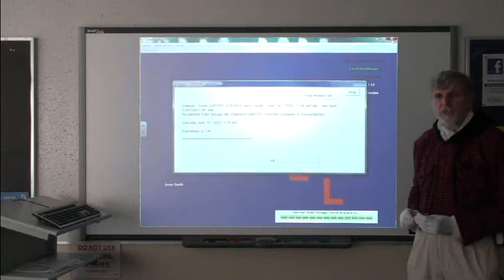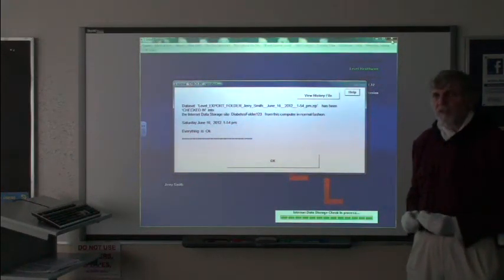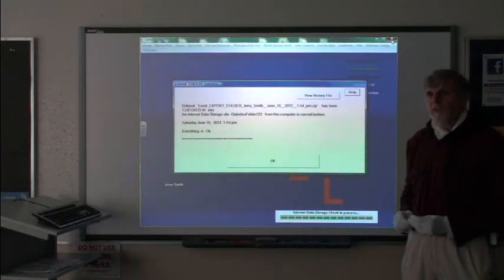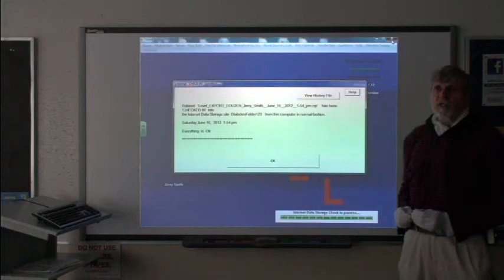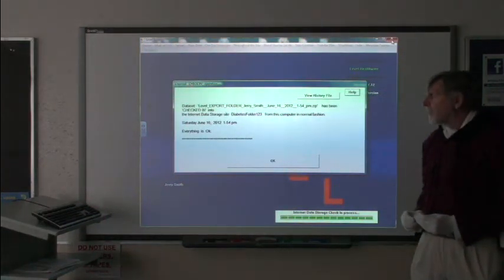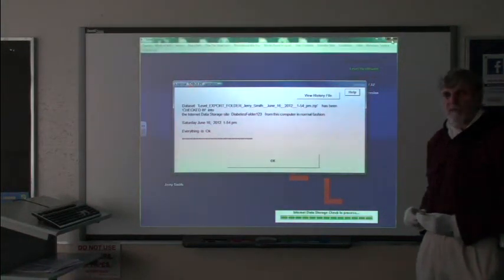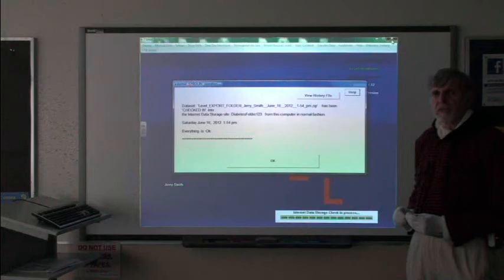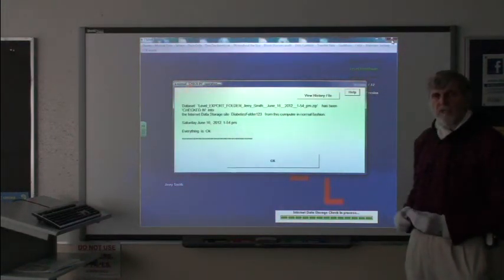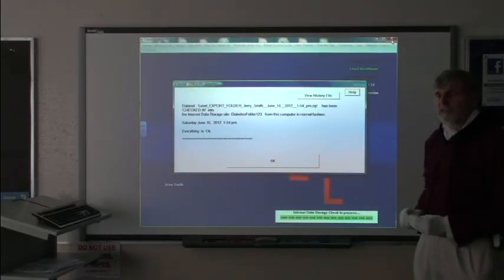It might be simply a case that you changed from one website vendor to another website vendor. It might be that you change from one physician to another physician. It might be that you change from using Level Healthware's company websites to using your own website, or it might be simply that you detached yourself so that you could work offline for some period of time and now you wanted to reattach. In all of those scenarios, we go through exactly the same steps that we've gone through here. We detach from one and then we reattach to the second.